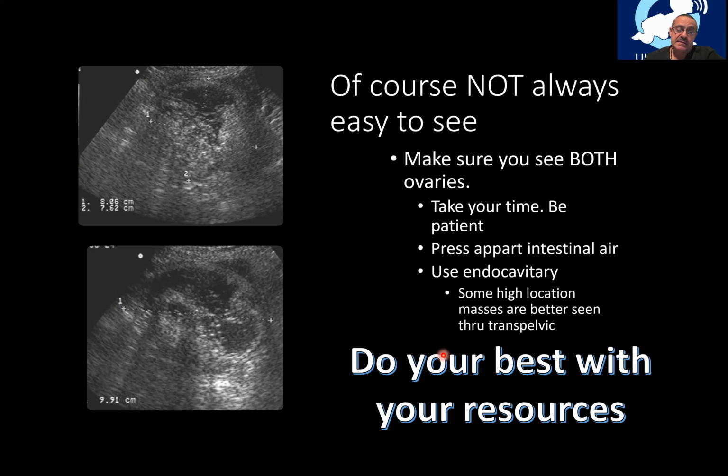This is a dermoid cyst as seen with an old machine with no harmonic imaging. This is a 5 megahertz convex transpelvic image of a complex ovarian cyst, which does not show clearly the posterior wall, the wall which is far from the transducer, but we can see some shadowing and spotting and complex things and a capsule.